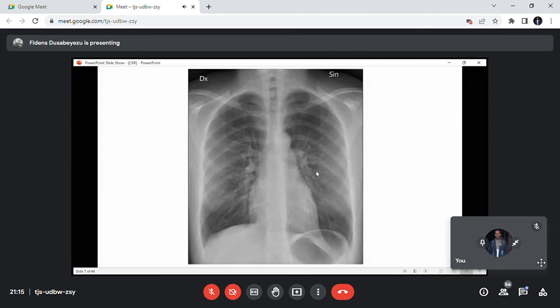In the hilum, some vessels are going up normally. You see them on many X-rays. Vessels are going up, others are coming down. So they make that concavity here. Can you see it? You can. See, teaching online in radiology is better than teaching on projection. Here you see as I am seeing it.